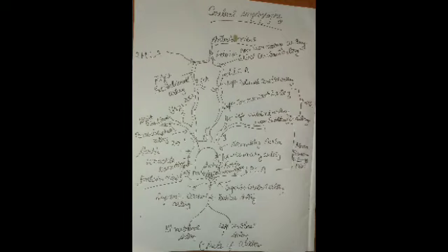From the ascending aorta, at the bottom you can see two branches. We get the right and left coronary artery, which supply the cardiac, that is the heart. That way we will see them in the cardiac or coronary angio. Next, from the arch of aorta, in the mid area known as the aortic knuckle, knuckle means a bend, we get three divisions.